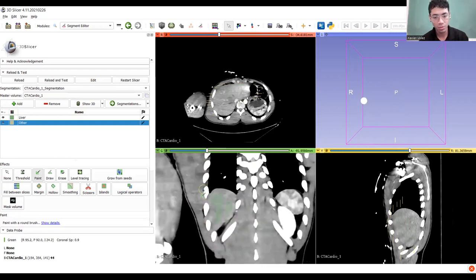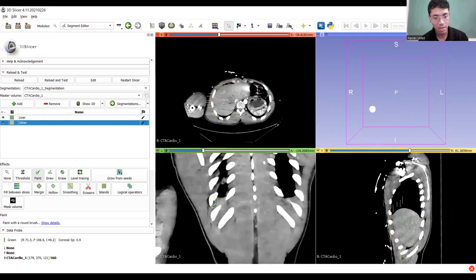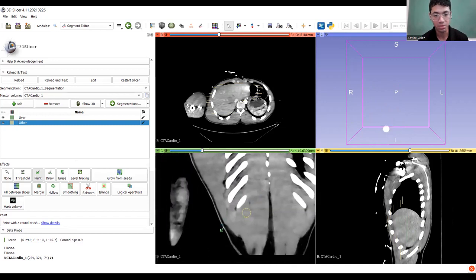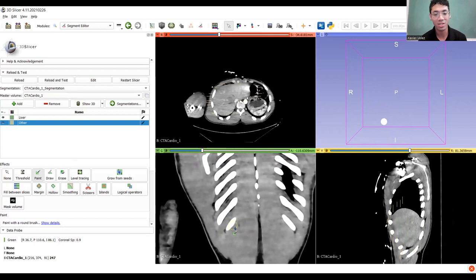And let's wrap it up over here. So once I see that there's, I guess, ribs, maybe, probably, crossing this, I know I don't want to take anything past this point, so I'm just gonna shade over the whole thing and over here.